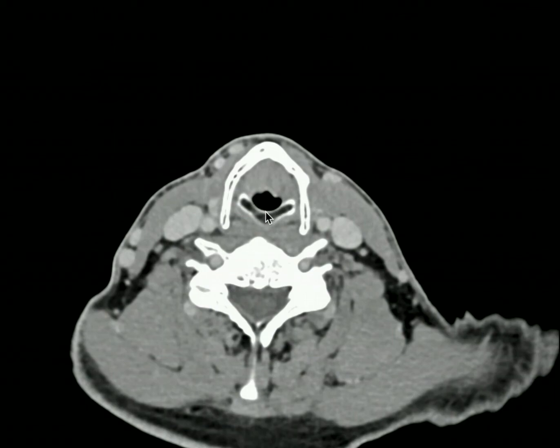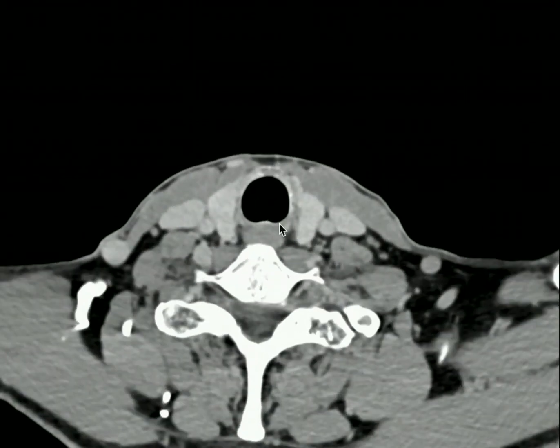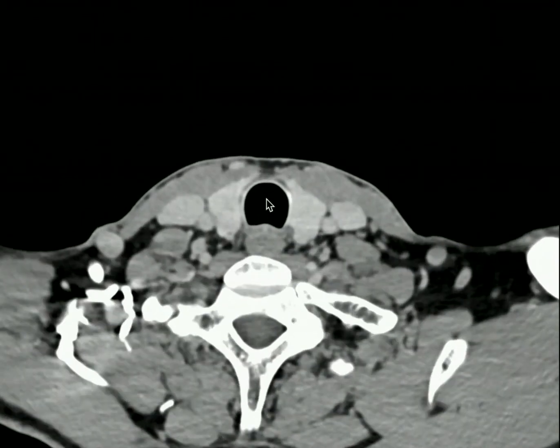of the cricoid cartilage. You'll notice I'm again using the same landmark that we used in the hypopharynx. The posterior wall and the postcricoid region also ended at the inferior margin of the cricoid cartilage. Likewise, the subglottis will end at the inferior margin of the cricoid cartilage, and at this point and below, we are now going to be at the trachea.